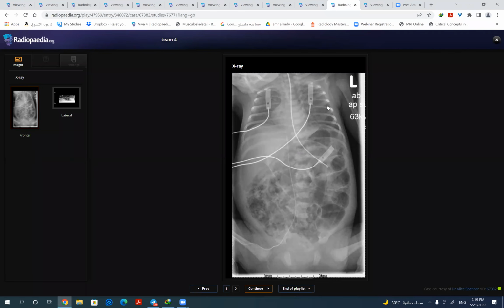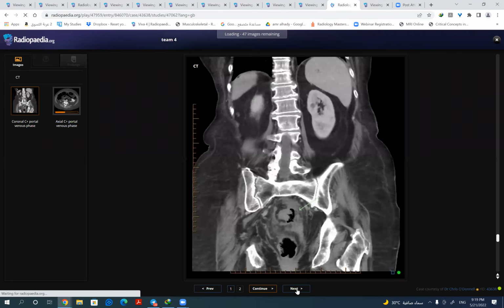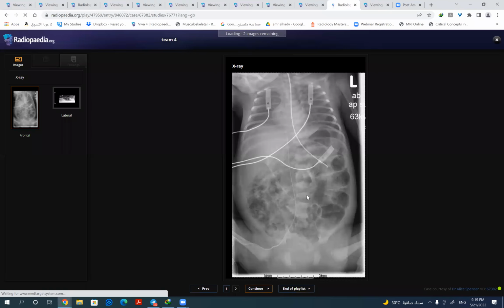And the lungs also, before you say it is normal, you must check well, because it is a continuum altogether in the preterm with all manifestations. So it is necrotizing enterocolitis with perforation and RDS. Just one comment, Dr. Awadh. There's no dextrocardia, right? No, no dextrocardia. Another thing, ARDS is not the same as RDS. There are 2 separate clinical syndromes. I think Dr. Iman said ARDS. Yes, sorry, I mean RDS, hyaline membrane disease. Of course, yes, of course you meant RDS.